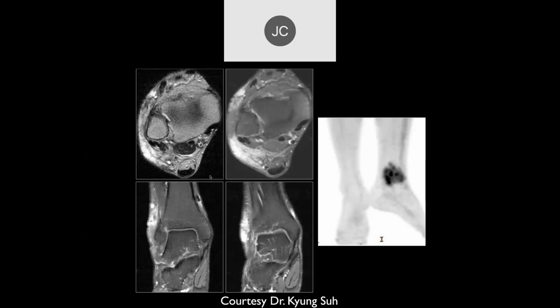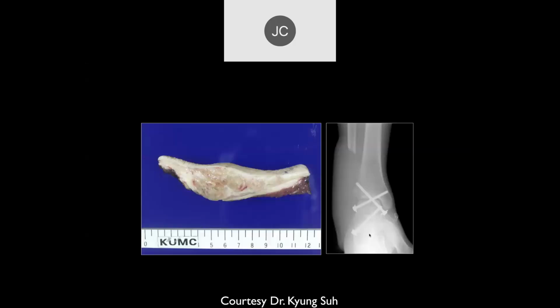Some cystic foci in there, some bright foci, and then there's a bone scan, I think. Some kind of scan. To be honest with you, I'm not sure. I would have guessed a PET scan, but it doesn't really look like the way we would present a PET scan.